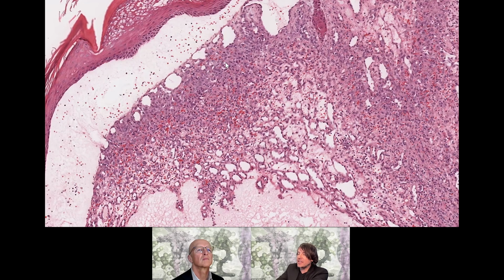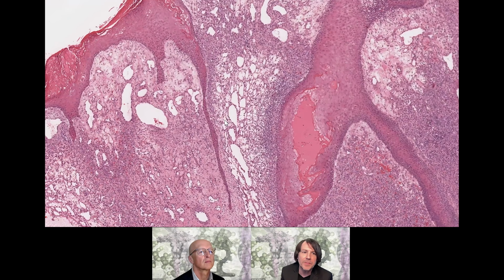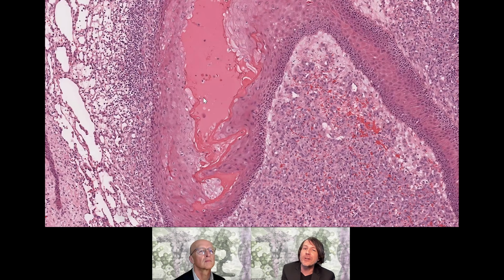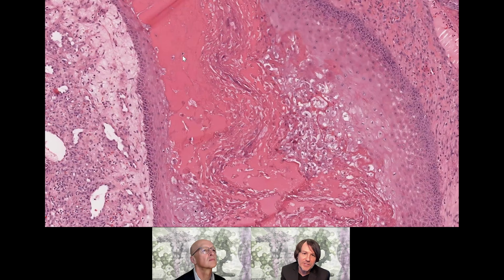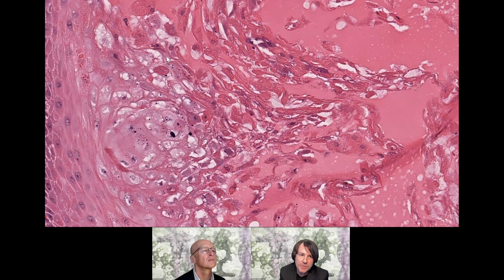So I'm really curious to see if anyone can get this from what you're showing them here. Because I think it'd be fair to have several things in the differential. This case, I don't get the credit for diagnosing. It had been diagnosed prior to me. It's from a long, long time ago, but someone gave me the recut of it, and then I found out the history. So it's just a lovely example of something that I don't see very often.